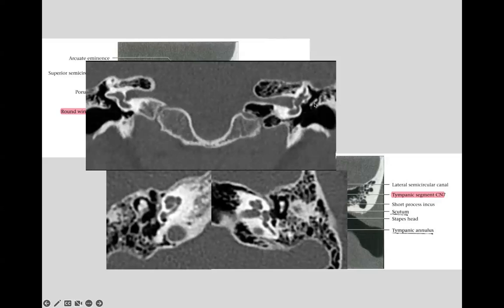This is the seventh nerve, and instead of being up there, it is down, so moved caudally, in the expected location of the oval window. But the oval window is not visualized, and in fact, you can follow bony density all around the inner ear hypodensity.